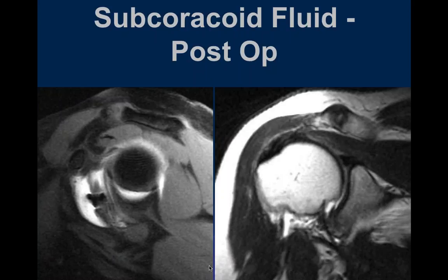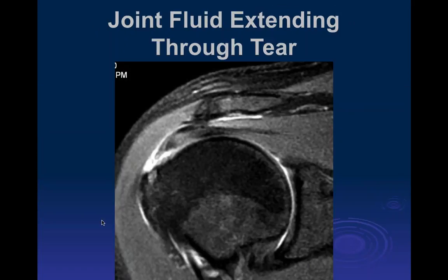Okay, after surgery, here we can see that there's surgery here. And here we can also see there are other reasons for having subcoracoid fluid, though by far the most common without surgery is going to be a rotator cuff tear.